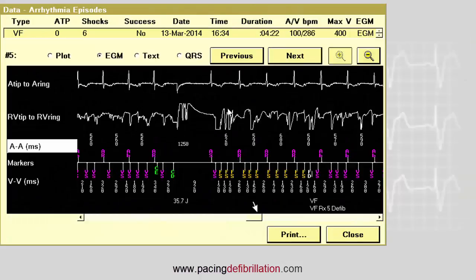And this tracing also highlights the interest of remote monitoring to arrive at an early diagnosis of lead dysfunction, for example when you can see the occurrence of short cycles or of non-sustained tachycardia or of an increase in the impedance, to prevent the occurrence of multiple inappropriate therapies.